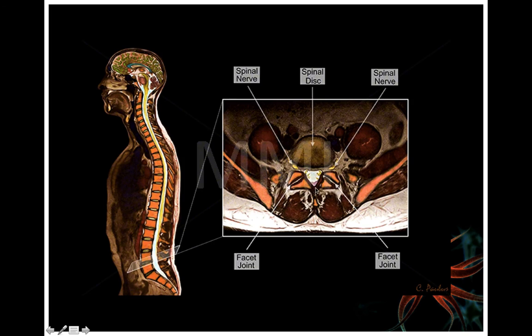They can become thickened with degeneration. Actually, some authors believe that it doesn't thicken, but it just buckles because things start sagging and then they buckle and they can crowd out the space of the spinal canal. So we want to look at the size of the spinal canal, and there are some measurements that show how severely stenosed or narrowed it is. As you can imagine, if the spinal canal narrows, there's less room for these nerves to breathe and function, so they can get compression and irritation.